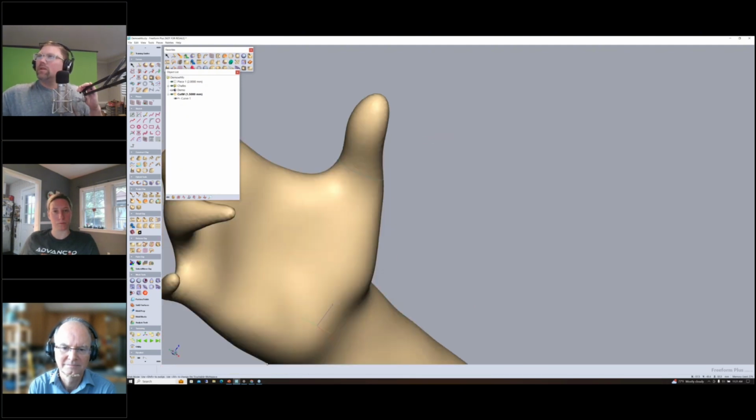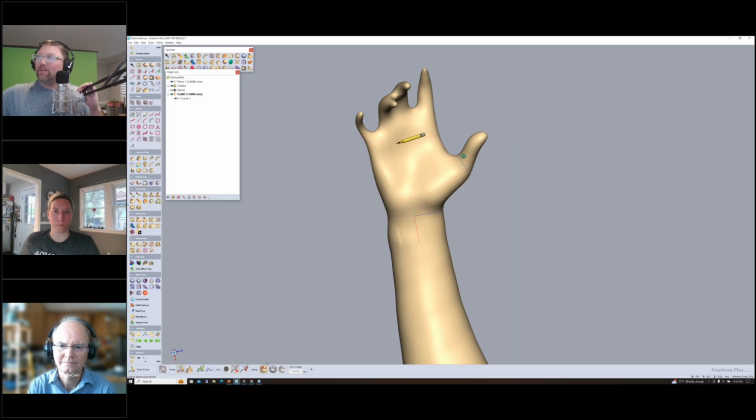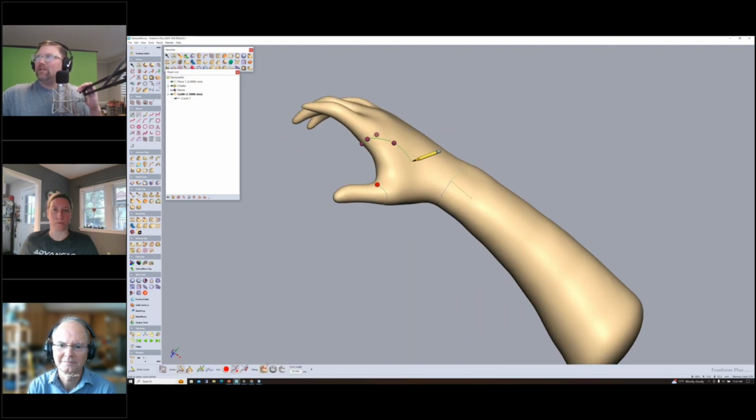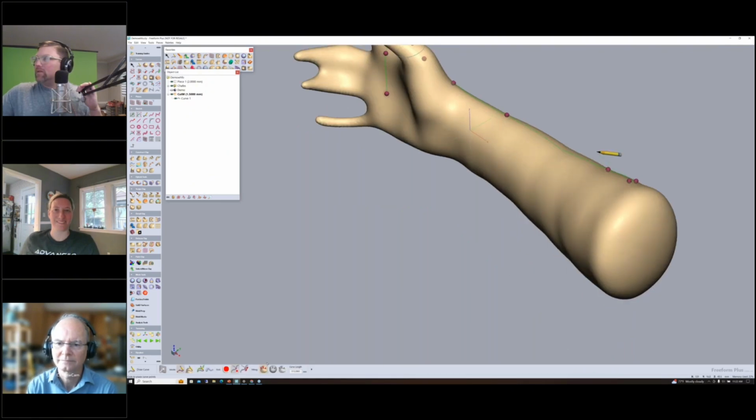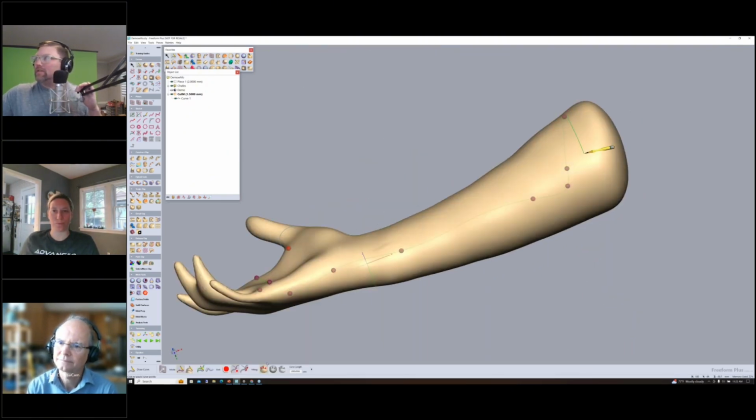Okay. And the cool thing is I can whip around this just by feel a lot of times. I don't necessarily have to see those marks because I can feel it on the back of the mold. And then just in the interest of time, we're going to quickly do this. And the people that make WHFOs for a living just know that this may or may not be clinically relevant. But the idea is just to show you what is possible.